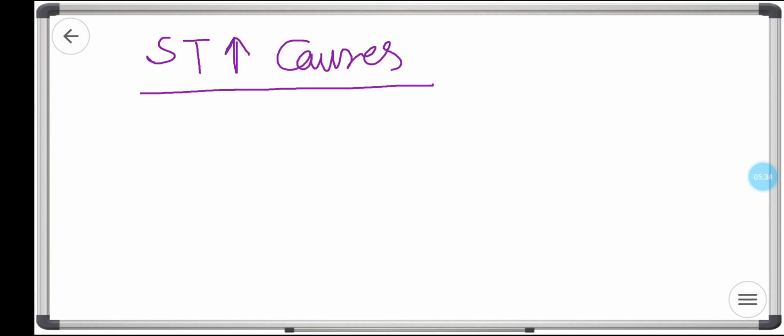Let's discuss the causes of ST elevation. You know, it's STEMI, that's ST elevation MI, Prinzmetal angina, pericarditis. But in pericarditis, there is diffuse ST elevation. Okay, you're going to see in almost all the leads there will be ST elevation, more than one.